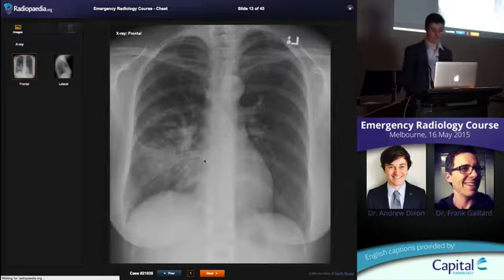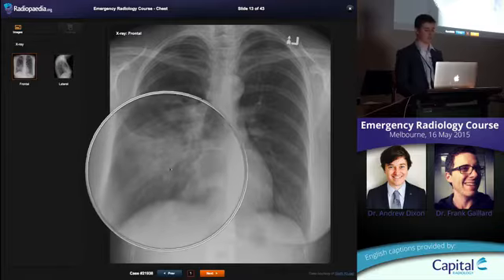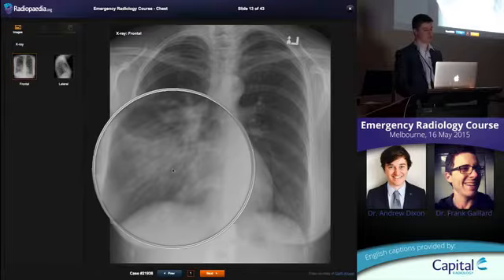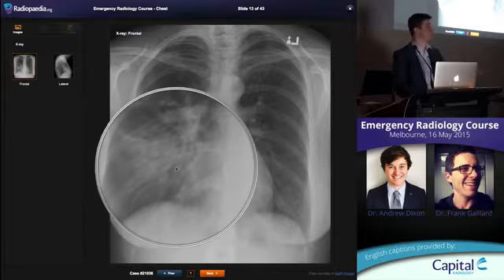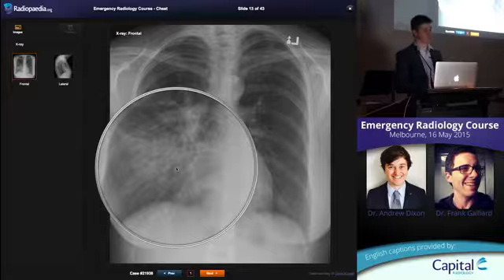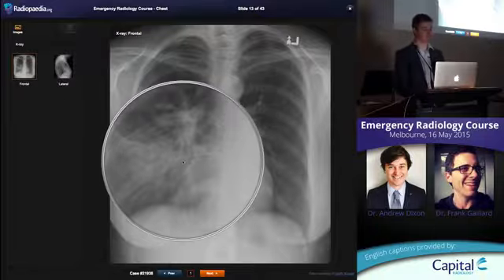All right, this patient here, we can see they're presenting with cough and fever. Another good example of air bronchograms. Can't trace the white vessels, but I can trace these black branching structures through here. So there's definitely opacity in the airspace. It's not as if there's fluid tracking in an oblique fissure to create this. You know, it's not pleural. It must be within the alveolar space in order to create those air bronchograms.